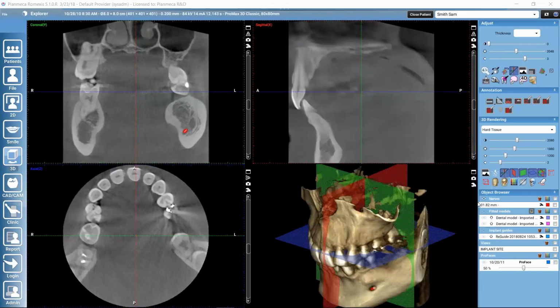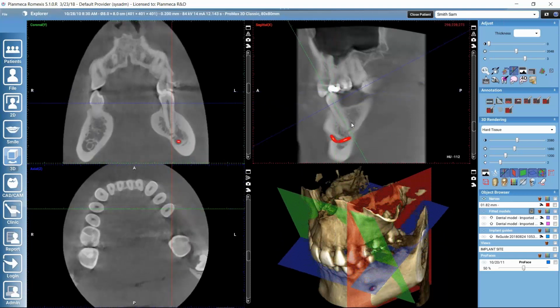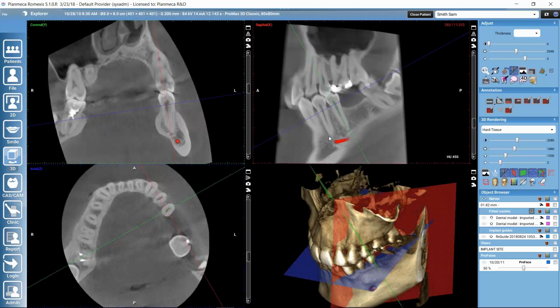I'll put them back. And let's close this. Let's then see how we can annotate these images. So firstly, if we navigate to some tools of interest here into data, here we could use these annotation tools in order to make any highlights on the images and measure lengths and draw something on the images. So firstly here we have some measurement tools and then some tools for highlighting something on the images.